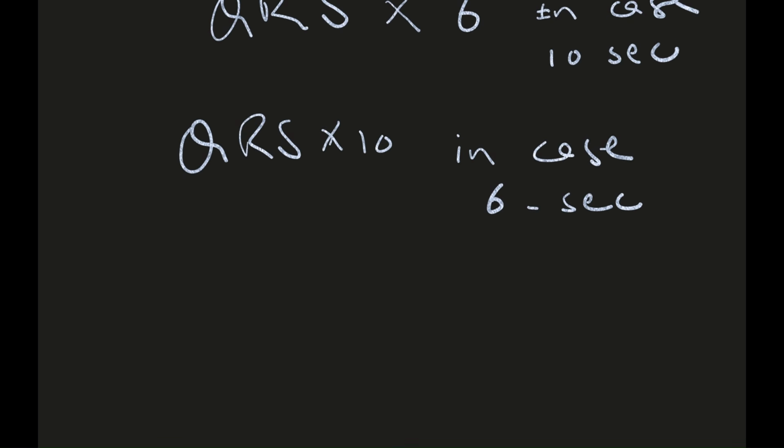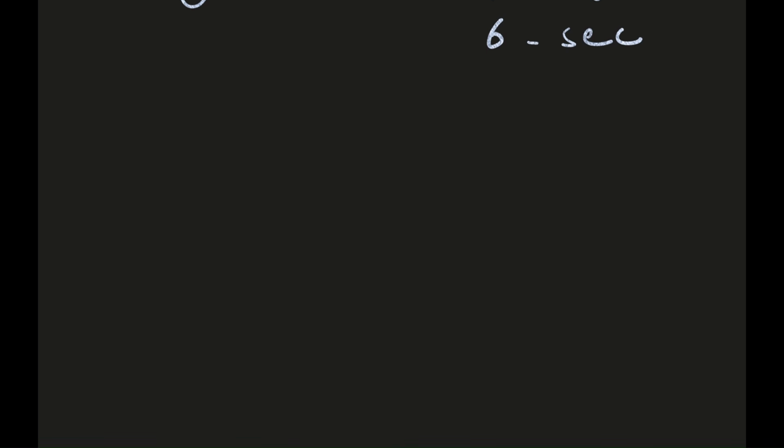So I hope it is very clear to you. Now, third thing, for house officers and med students or interns, is axis. Many people would have told you the rule of thumb, and there are many tweaks, but let me give you a very simple and easy way to remember, to see if it is left axis deviation or right axis deviation.